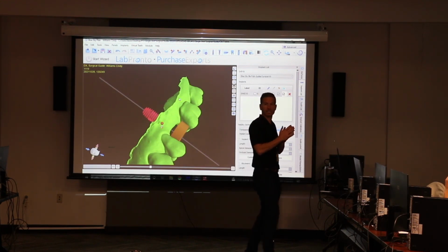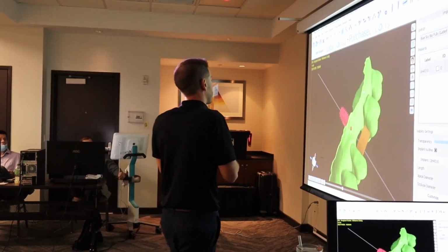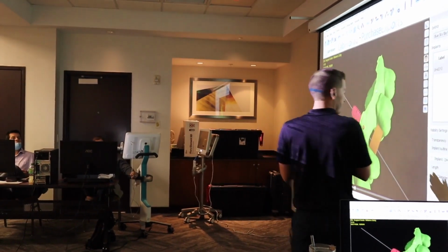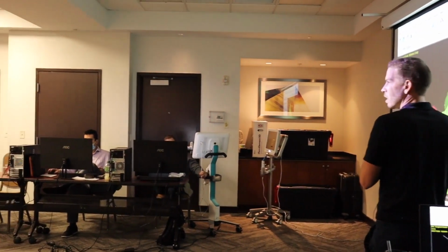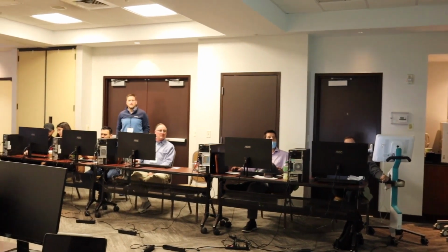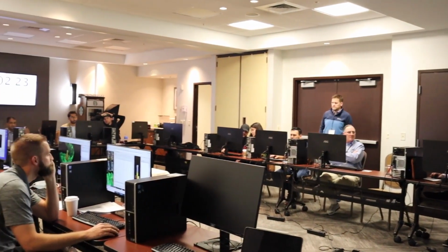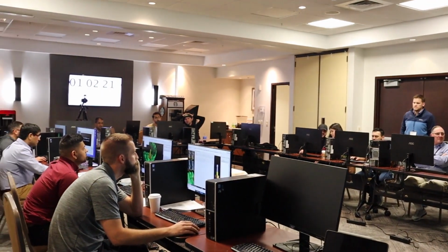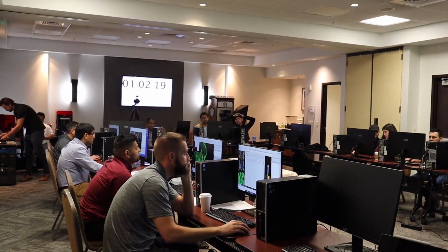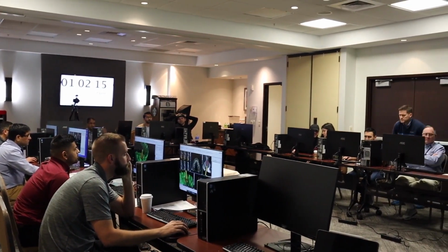Where is the outside diameter? That's the internal, right? The guide hole diameter is the internal diameter. Yeah. The guide tube diameter is the internal diameter. The outer diameter, again, doesn't matter. I believe it's deep in the settings, but I've never changed mine. Well, it probably needs a certain thickness for strength, right? Yeah, exactly.